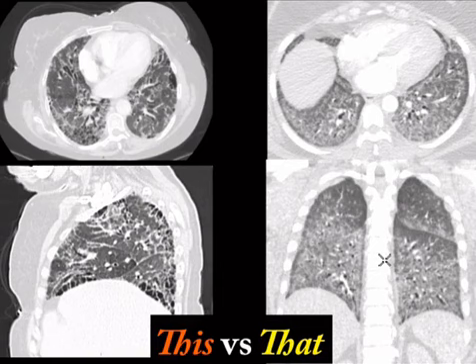The other reason to show a sagittal CT image in a thoracic case is to show you that there is sparing of the costophrenic angles, because there are certain things that do that, like LCH. You can show sparing of the costophrenic angles in an axial plane. I just think that's way harder. Most people would show it in sagittal.